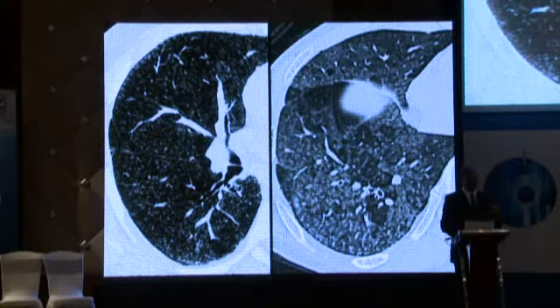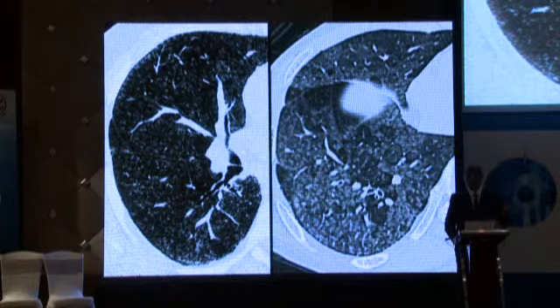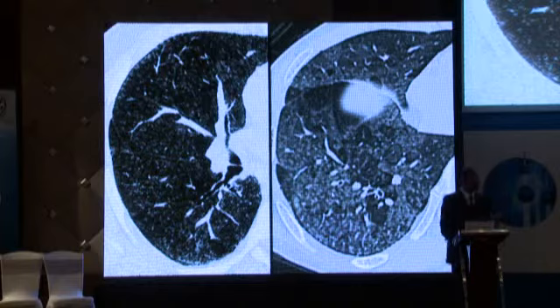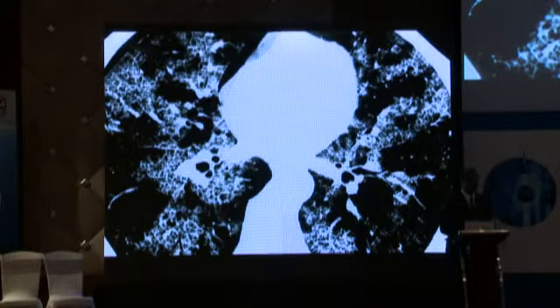Sometimes, though, we have other findings that help us. So within the ground glass attenuation, if we see these confluent, ill-defined centrilobular opacities, then this is very typical of hypersensitivity pneumonitis, right? So if we look inside the ground glass and if we see these nodules, you see them a little more subtly at the periphery here, then this tells us that this is hypersensitivity.